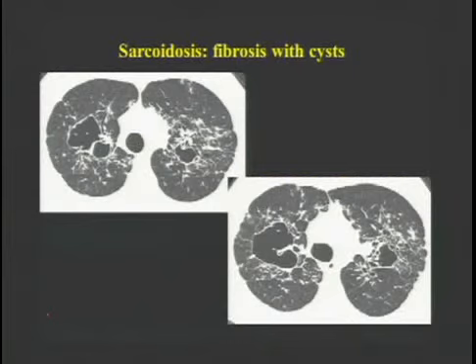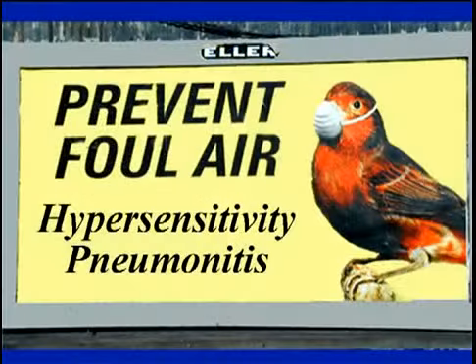Patients with end-stage sarcoid can develop cystic lesions in the upper lobes. Sometimes these represent dilated bronchi, and sometimes they're simply cysts, but this appearance is not uncommon in end-stage sarcoid, and because of these, mycetoma is reasonably common in patients who have end-stage sarcoid with lung fibrosis.